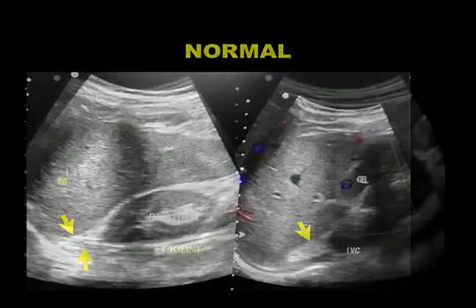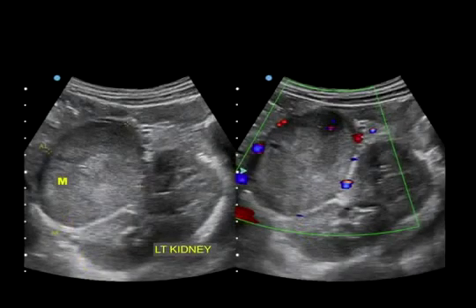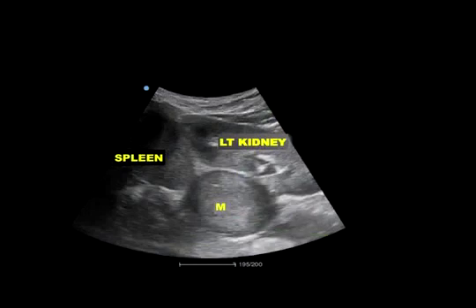So our first patient who was presented was a 25-year-old female with a left suprarenal mass. When you do an ultrasound, you see this well circumscribed hyperechoic mass, though with areas of anechoic, which would be echo complex. And we see it's also relatively highly vascularized, but a well circumscribed lesion. Again, when we did a coronal oblique scan, we see that round, well circumscribed mass in the left adrenal.